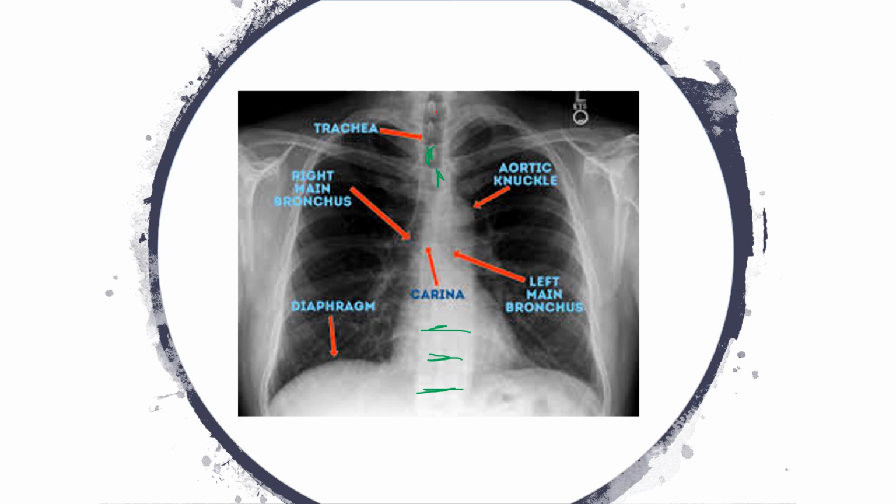Of course, the trachea, I love following the trachea because then it goes into my main stem. So that means my carina is right here, and my left main stem's right there. So I can sort of see my separation there. If you can't see it right now, that's okay. It took me hundreds of x-rays before I got all this stuff down.